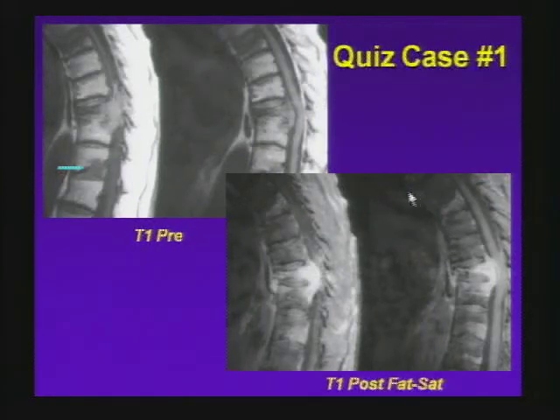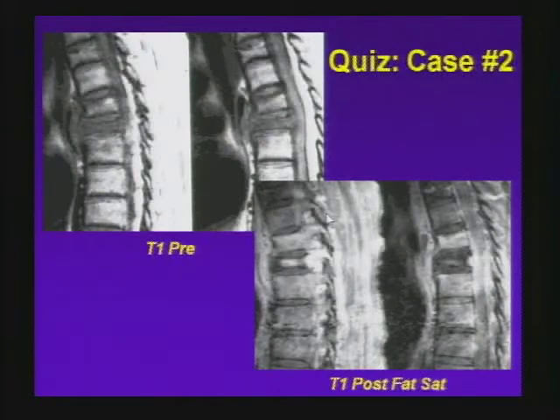It's very localized. The posterior elements, again, are very hard to see sometimes on the sagittal, but here you see this is the lamina. This lamina is normal, this lamina is normal, that lamina has tumor in it. So you may not actually get the axials because, say, the patient desaturates or is claustrophobic. Sometimes you don't get all the images you want, but you have enough here to say overwhelmingly likely this is tumor and overwhelmingly likely neoplastic. This was a lung met. Okay, so the features: several lesions, not a lot of ligamentous enhancement, posterior element involvement. So those are the things that you should bear in mind looking at case number 2.